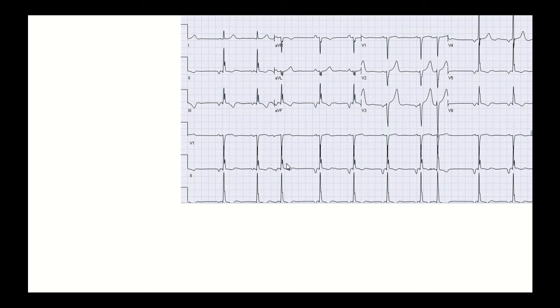of the QRS complexes that make it most likely some kind of supraventricular initiated rhythm. But the P waves are down in 2, so they're not really sinus. The PR interval is a little on the short end as well, and for the most part these waves do look pretty consistent. There are a couple that don't look quite the same, but a lot of them do.